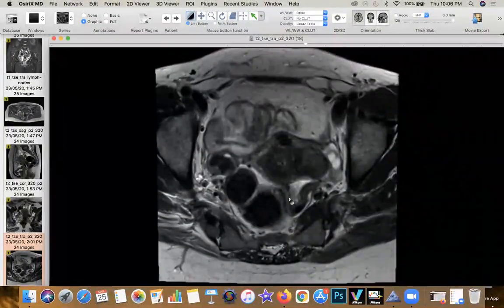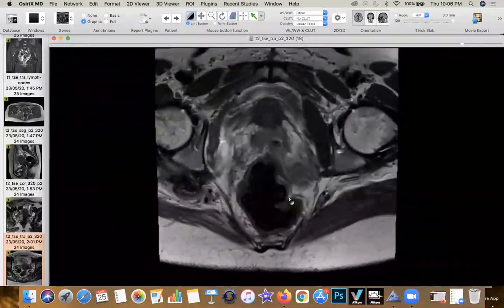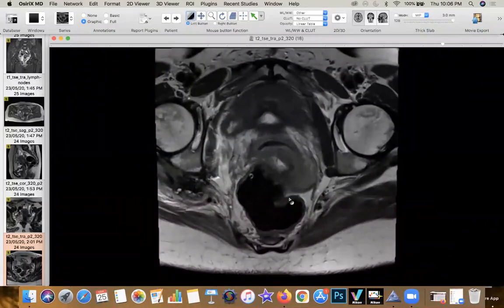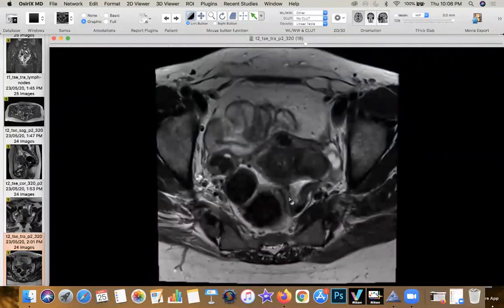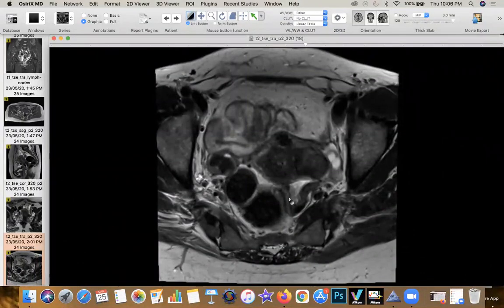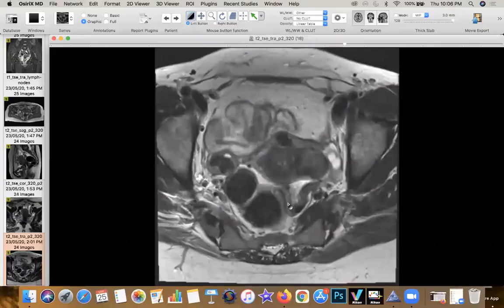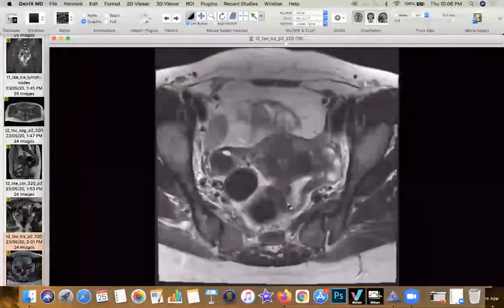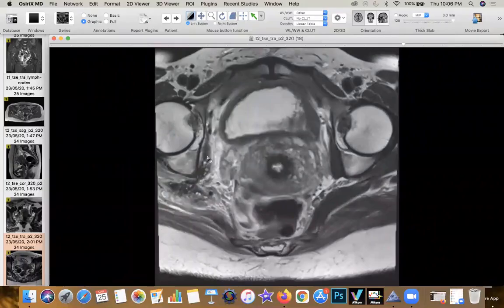So I've covered the entire gamut of pathologies which affect that location. But there's an important gamut which is now known. I've gone from peritoneal to subperitoneal, or what some people would call retroperitoneal. There are two gamuts of pathology which need to be looked at very carefully, and that is the extraperitoneal nature of the disease itself. One of the classic sites of extraperitoneal involvement is the pelvic side wall.